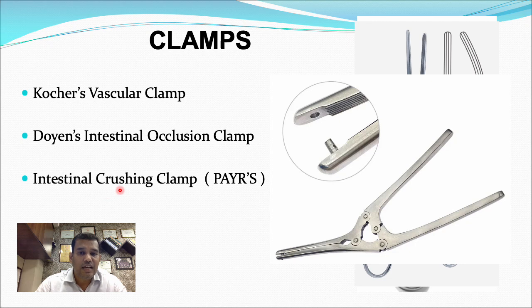So you apply this as an instrument. How do you sterilize this? The sterilization remains the same, that is the autoclave.